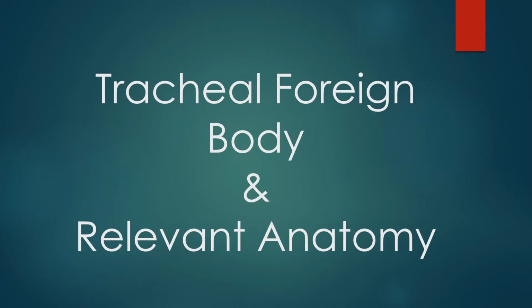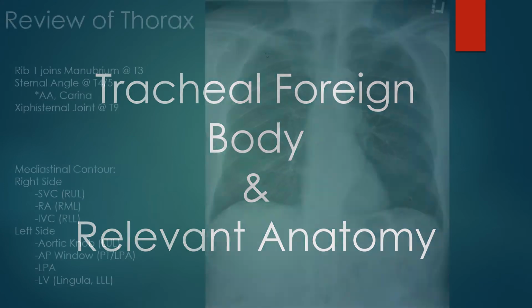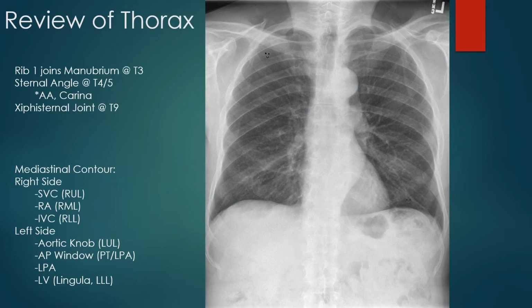So in this presentation, I'm going to walk through some of the structures we need to know for the thorax, as well as 2 case studies on tracheal foreign bodies. So the first thing to do is go through this PA radiograph. You can pause the video here and make sure you appreciate all the structures.